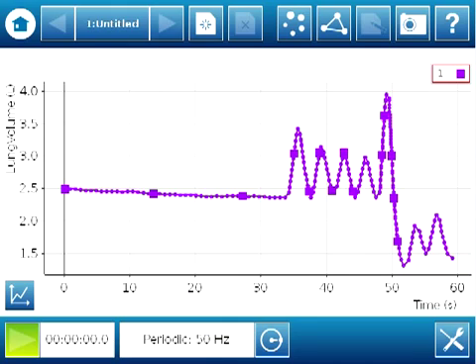In this video, we'll focus on using the built-in tools of SPARKvue software to analyze data related to changes in lung volume. In part 1, I collected data under two conditions, normal breathing and maximum inhalation followed by forced exhalation. We'll use that data to find tidal volume, vital capacity, and forced expiratory volume in 1 second. Let's revisit the graph of lung volume versus time from part 1.